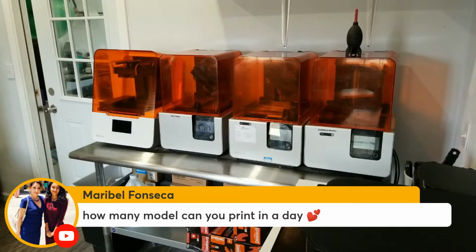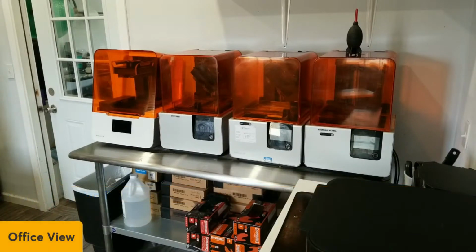So that's how many I can do a day with those 3D printers. Actually, I'm going to look that up, and if somebody wants to put it in the comments. I'm running a blank. Let's see. 18. 36. Okay, that's what was popping in my head, but I was feeling like it was wrong. So I can do 36 a day, which is good.